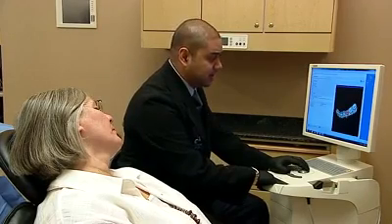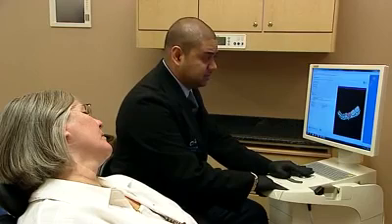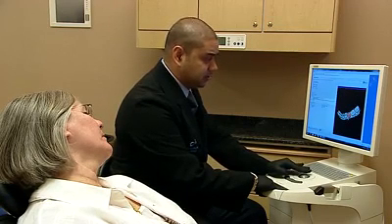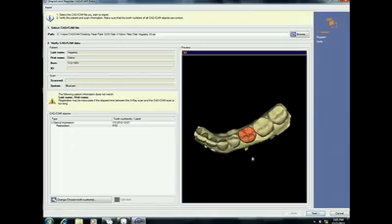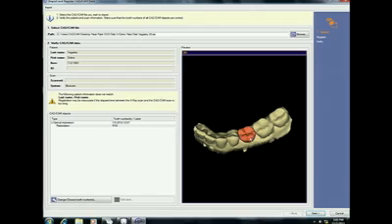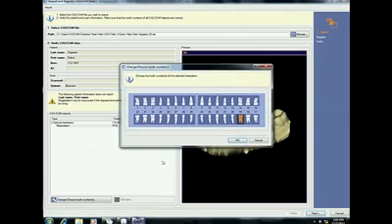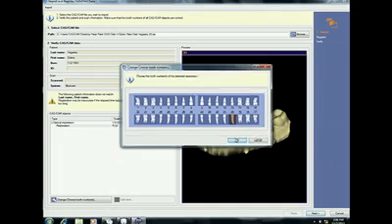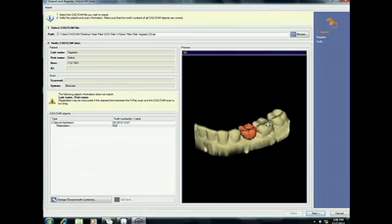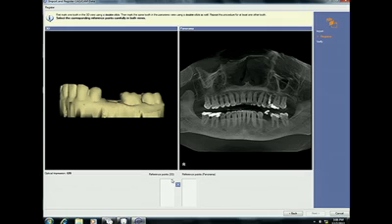Now obviously you had a pediatric tooth or a baby tooth that was there that needed to come out. That baby tooth happens to be much larger than the premolar that you were missing. So in the software, for the rest of the clinicians, you can see that the tooth was labeled as 19 so that CEREC can actually design the appropriately shaped tooth for that edentulous site. We can relabel that, just for numbering and documentation purposes, to tooth number 20, which is really what tooth we're replacing for Deb.